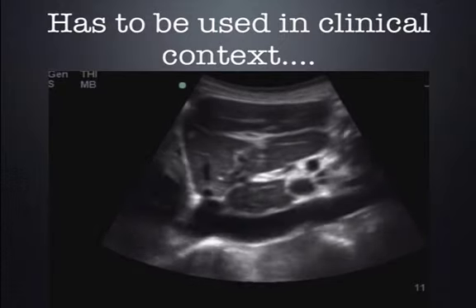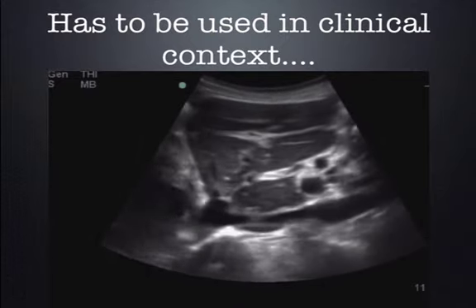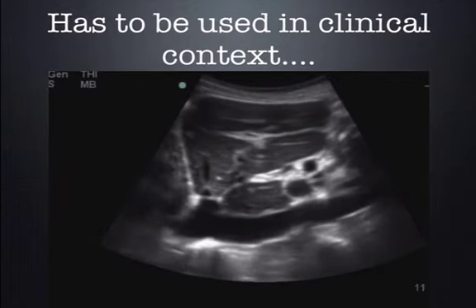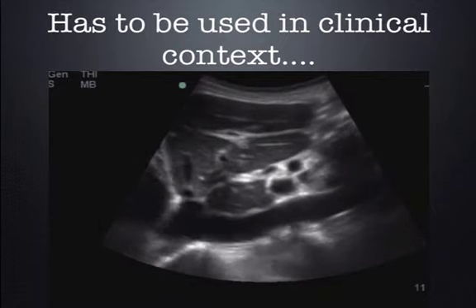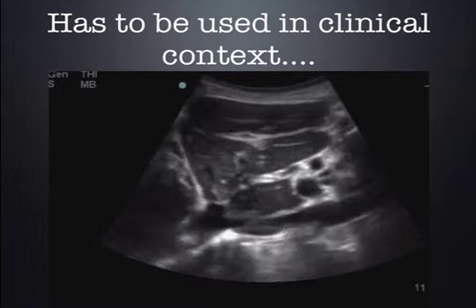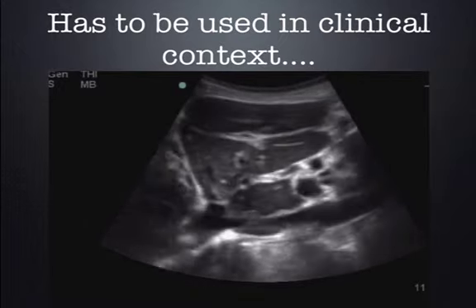The last point I want to make before we move on to the pump is that the respirophasic changes in the IVC diameter really have to be used within the clinical context. Over the years, doing workshops and scanning on models who have absolutely no complaints and are physically fine, we've seen plenty of IVCs that were slit-like and 100% collapsing. Certainly doesn't mean that patient needs to be rushed off to the emergency department and given large volume resuscitation. So you use these findings within the clinical context.